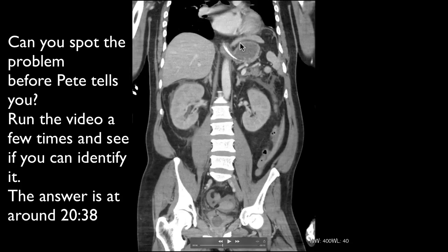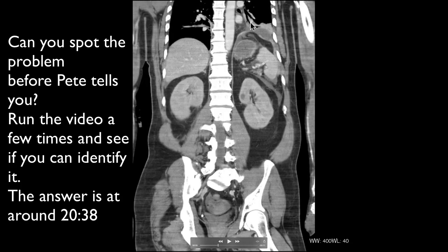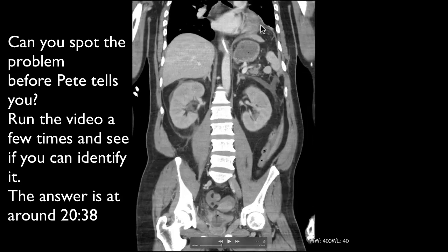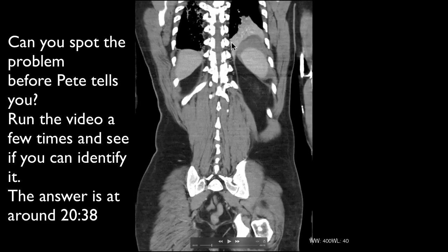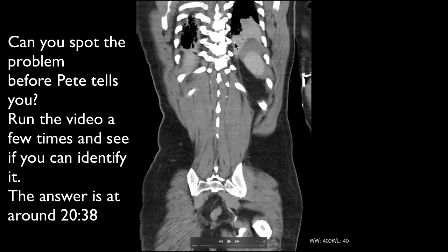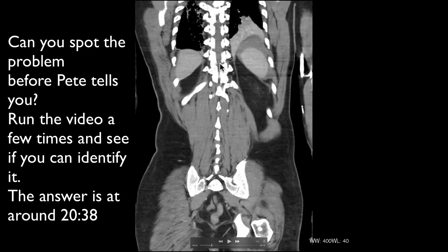And this one, as I say, you'd start with the lungs, and there's something to see in the lungs here. You can see this is an air bronchogram here, and you've got a bit of fluid at the base, at the left lung base, with a bit of associated consolidation. Again, with the inflammation you get with pancreatitis, you often get changes in the lungs. There's more consolidation there on the left and the right.